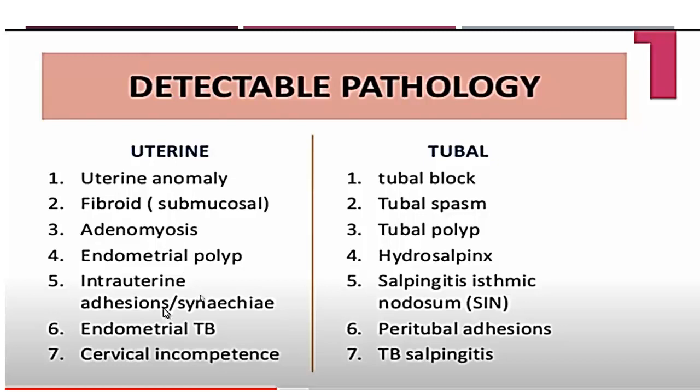endometrial filling defect. Intrauterine adhesions or synechia, endometrial TB, and cervical incompetence. This is what we can see on hysterosalpingiography in the uterus, but of course we see only the cavity and we could not detect the myometrial lesions or the associated pathology.